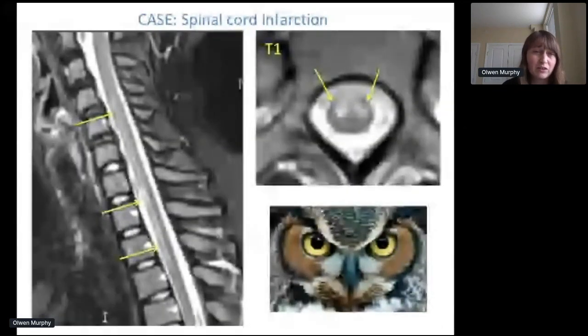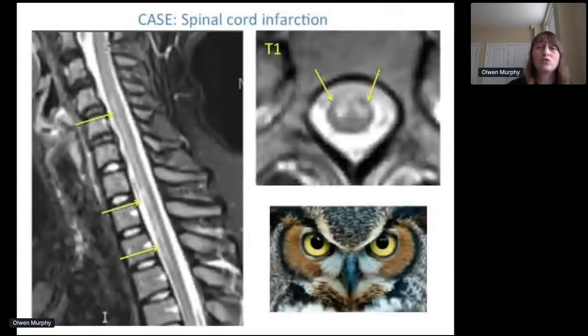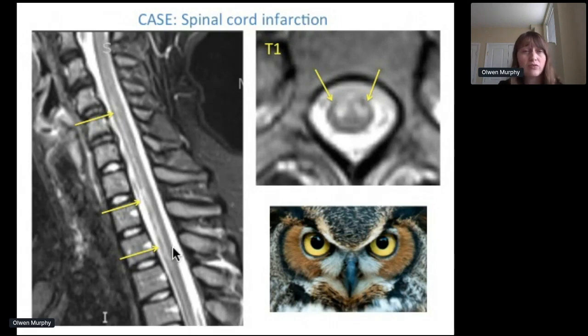Spontaneous spinal cord infarction or spinal cord stroke should also be considered in these patients. While this is actually thought to be uncommon in children, in our center we have seen that it's frequently misdiagnosed as transverse myelitis, and it's simply not recognized in many children. The MRI lesion in a stroke of the anterior spinal artery, such as in this case, often involves the grey matter, but does not tend to involve the posterior grey matter as much as AFM does. And this is why we get this owl's eye appearance even in the acute phase in some of these patients.